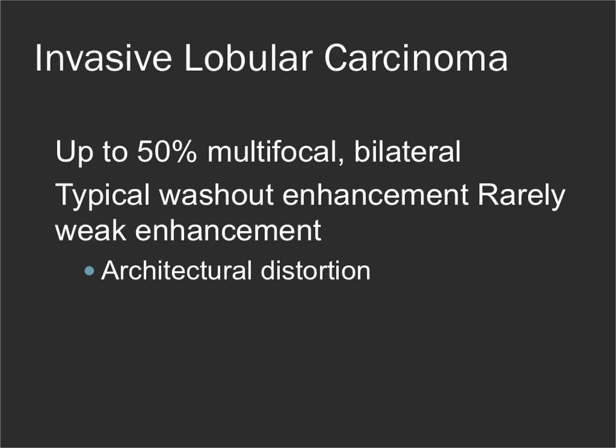MRI is a really good way of seeing the extent of invasive lobular carcinomas, and when our patients have this, we virtually always recommend our MRs do a staging breast MR. About 50% can be either multifocal or bilateral, and the typical enhancement pattern is usually washout, but every now and then it can have relatively weak enhancement or progressive type enhancement characteristics. And similar to the mammogram, one of the things that we look for is architectural distortion.